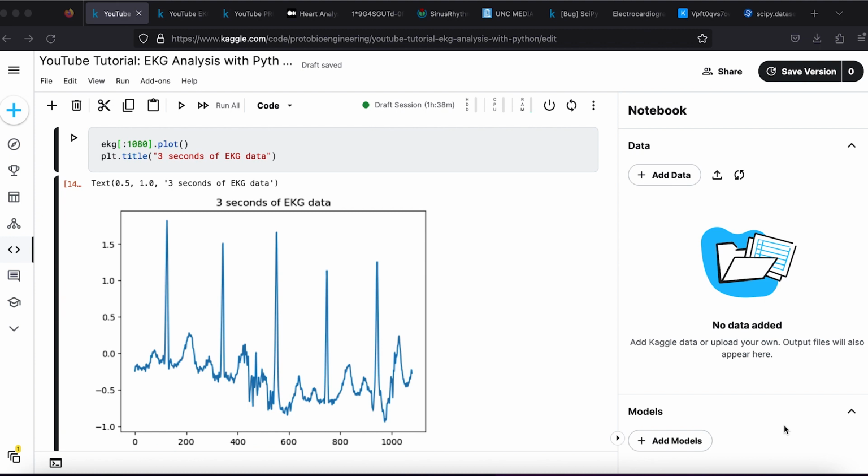So we have all of these waves with special letters for names. What do we do with that in the code? What we're going to do is use SciPy, specifically SciPy's find_peaks function, to find and label all of these waves according to their height and position. The easiest example of this is we're just going to take every gigantic spike over a certain height and call that an R wave. And then we can use each R wave to determine how fast the person's heart rate is.